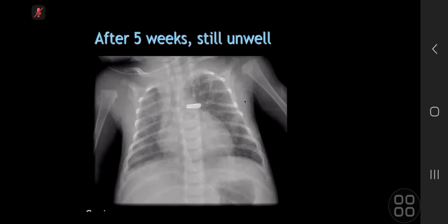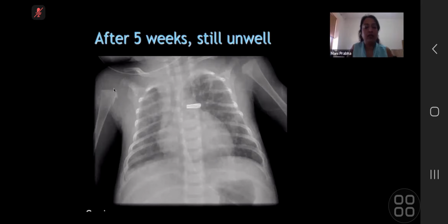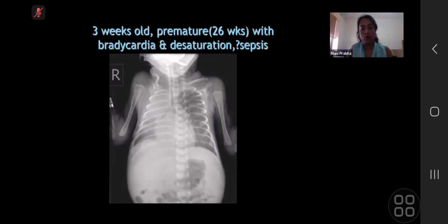Besides, in a 5 weeks old child, the humeral epiphyses are not still seen. They are seen definitely by 41 weeks. So the child has to be a preterm child. They may not be seen at 37 weeks, but they are definitely seen at 41 weeks most of the time. And there is some opacification in the lung in a preterm child. Bronchopulmonary dysplasia or chronic lung disease occurs due to ventilation. So that's what is going on.